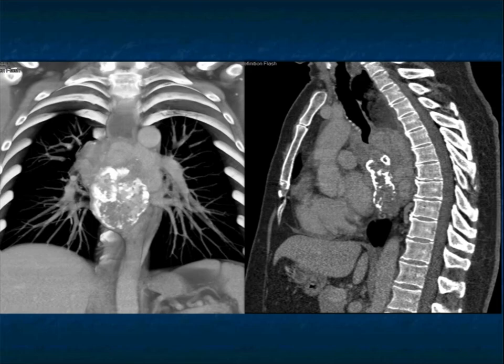Now, things of the esophagus that calcify: leiomyomas, you can get punctate calcifications. Perhaps the patient has an aggressive leiomyosarcoma with really coarse calcifications. Perhaps the patient had radiation therapy for lymphoma, but that wasn't the case here. A teratoma, some other unusual sarcoma. Those are all things I'm thinking about.